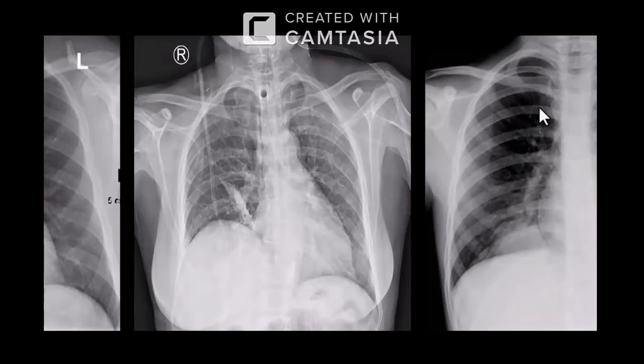With a history of thyroid carcinoma and post-resection, there is a high probability that this patient has an injury to the phrenic nerve. I can also see the left central line, a PICC line, in appropriate position. I will compare it to any preoperative chest X-rays if available, because that would support the diagnosis of phrenic nerve palsy or injury. This patient requires referral to physiotherapy, and a neck MRI can also be done to assess the residual soft tissues.